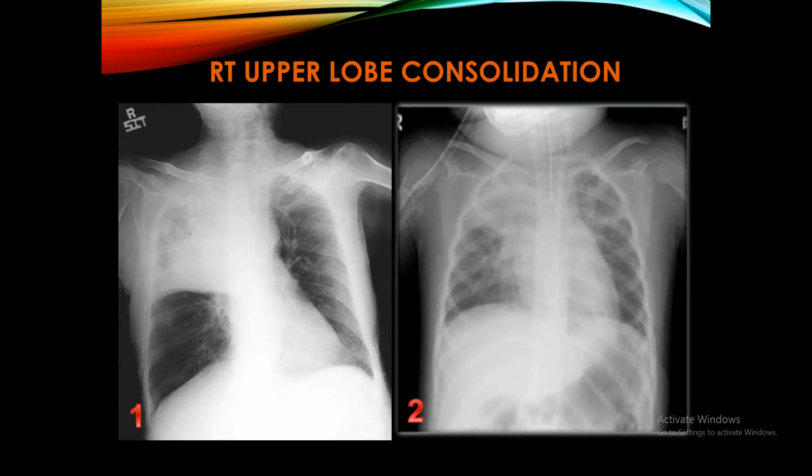شلون عرفنا إنه هي right upper lobe؟ لأنه هي limited inferiorly by the horizontal fissure. Any opacity limited inferiorly by the horizontal fissure should be located above the horizontal fissure, لأن horizontal fissure هو اللي يفصل لنا بين upper lobe والmiddle lobe. And vice versa, any opacity limited superiorly by the horizontal fissure should be located in the middle lobe. راح نشوف عليها أمثلة في الإشعاعات القادمة.